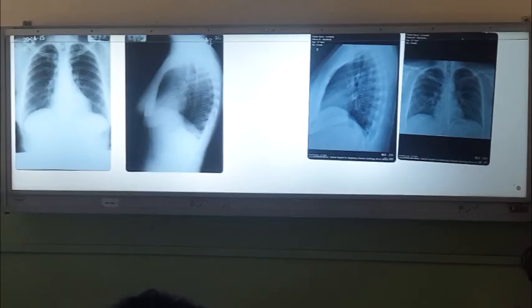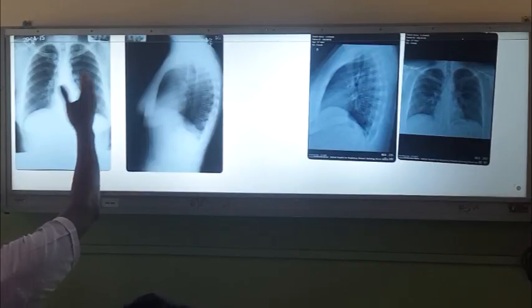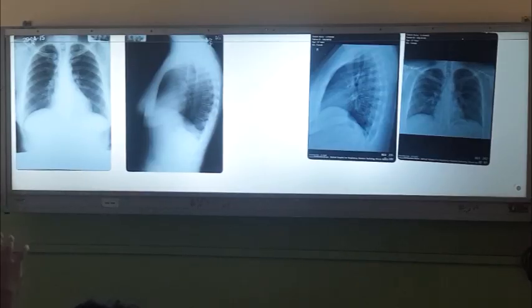Right. So before reading any X-ray, the identification is important, say name, age, everything. Sometimes the date is important, and identification is very important because you might take decisions by looking at all the X-rays, right? And even if the X-ray is normal, you get the patient to preserve these X-rays, keep them, right? Later on they are going to help you, right?